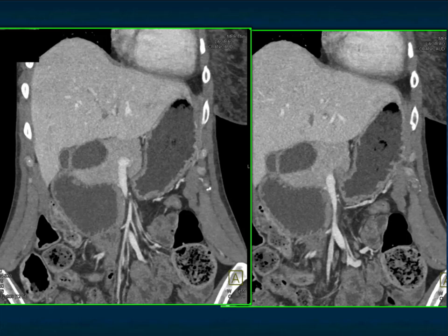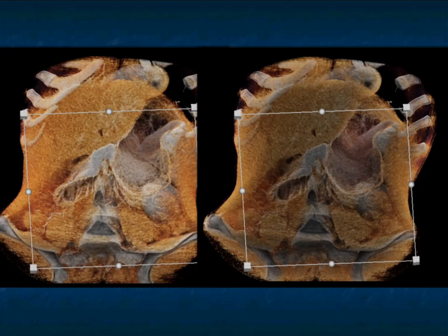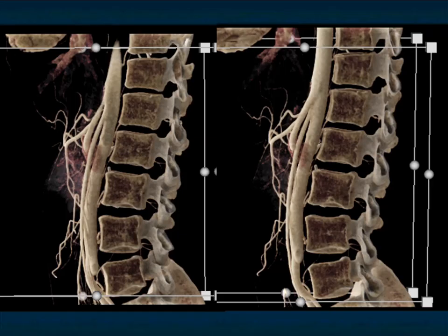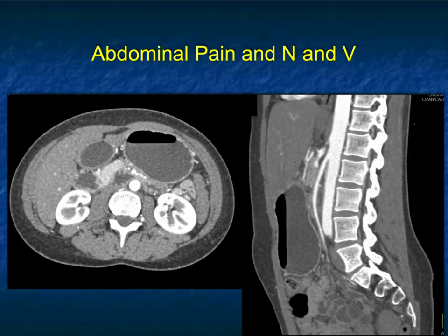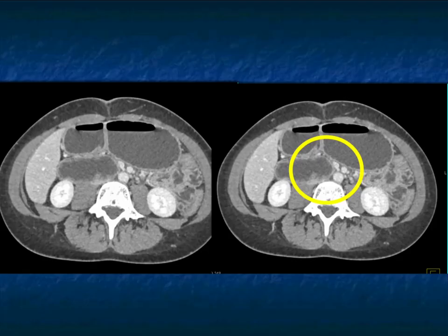I think the coronal views are especially helpful when you're trying to show the clinician where the duodenum transition point is, and it's right at the level of the patient's SMA, as shown nicely there. And here it is really nicely shown on cinematic rendering, duodenal folds, and there's the transition point right there as well. And there's the decreased angles, very nicely shown. And finally, one more case, decreased angle, decreased distance, duodenum is dilated, and again, a patient with SMA syndrome.